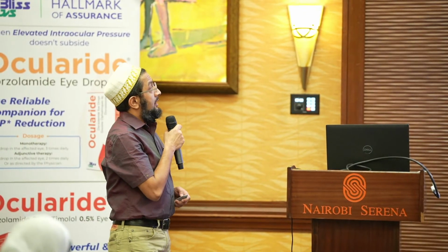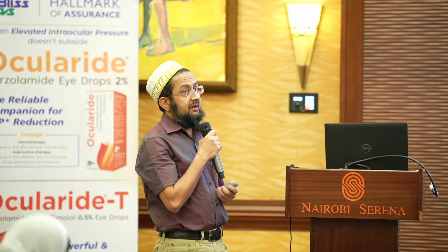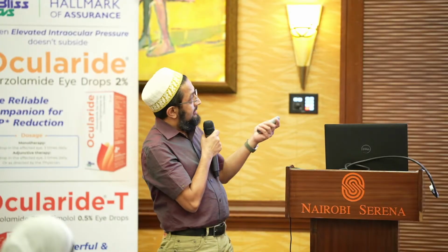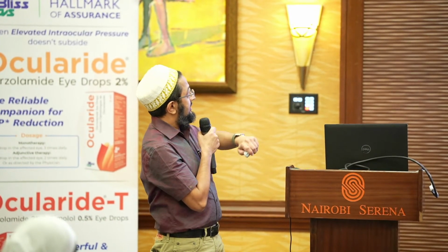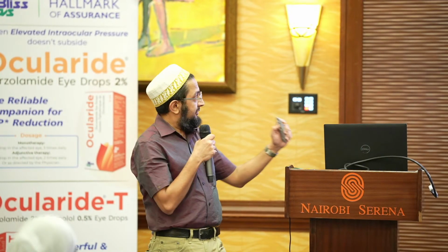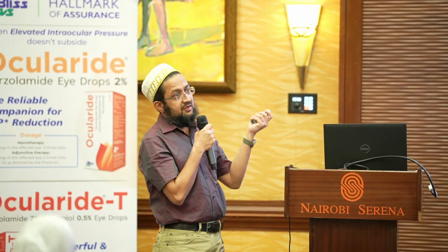Something to think about. Now, this is an ultrasound. I've put it here because I'm going to tell you something which I faced during my fellowship. You can see the ultrasound on your right-hand side. The lens echo is in place. You can see the optic nerve head and everything is clear. On your left-hand side, you can see there's a globular echo and there's vitreous inflammation.